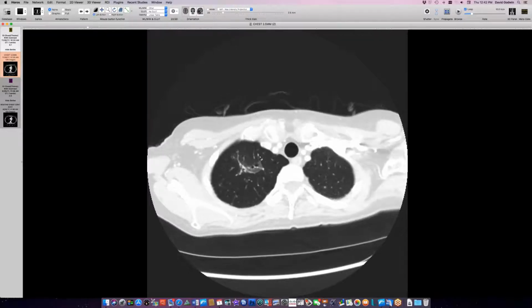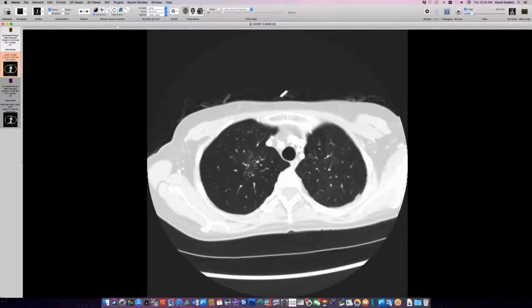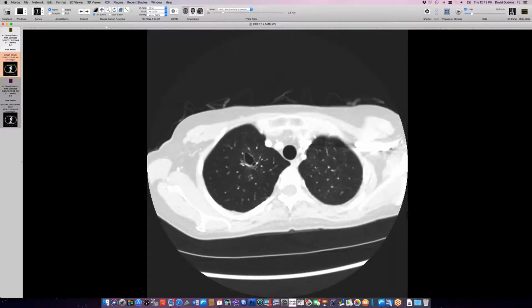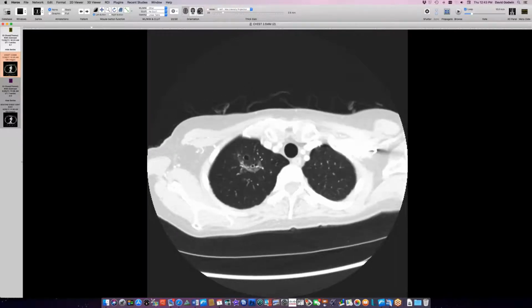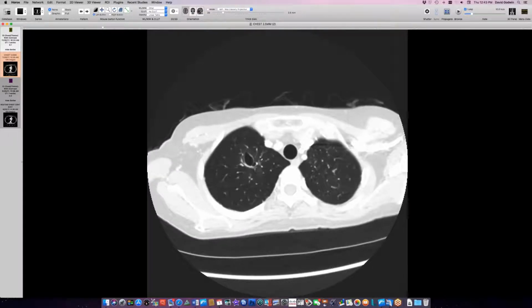We can certainly see a small bronchus leading right into it in its proximal medial portion. So it could be a localized dilated bronchus, with destruction of the wall and so on. That's pretty dramatic. It occurred quite quickly. So I'm pretty sure it's a lung transplant, then constrictive bronchiolitis, and an opportunistic infection here.